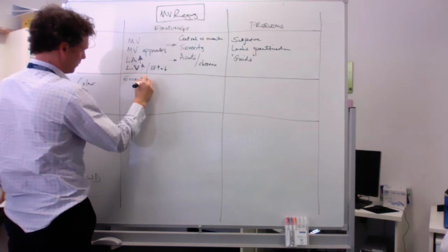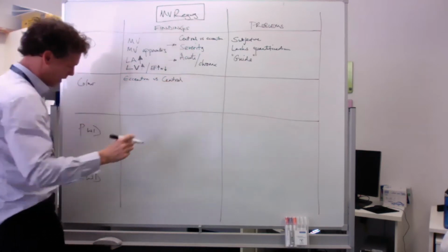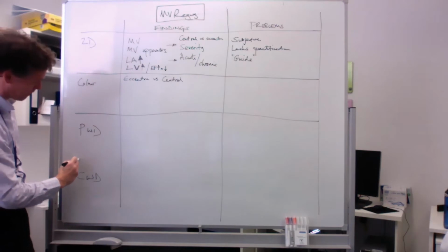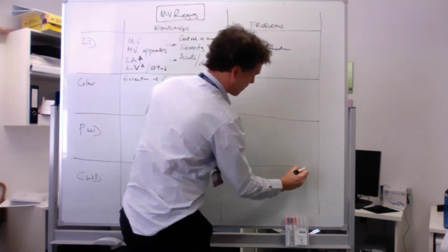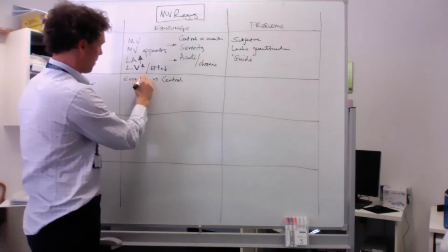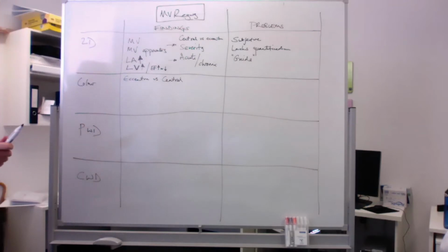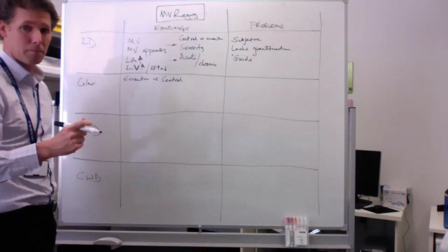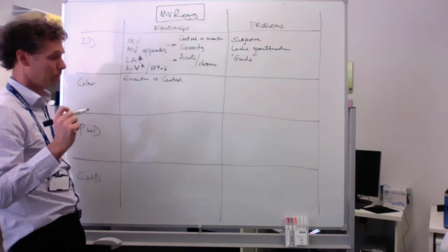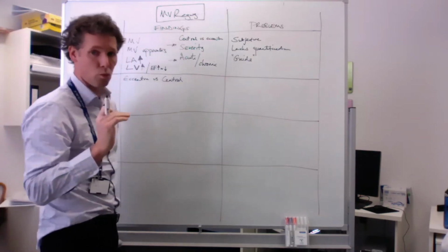So the characteristics speak to the mechanism. And why do you care about that? So it helps you put together the picture of the pathological process that's causing it. And it also helps you grade the severity. So eccentric jets being more difficult to quantify with color Doppler and more likely severe.